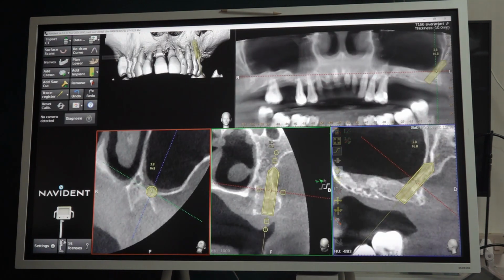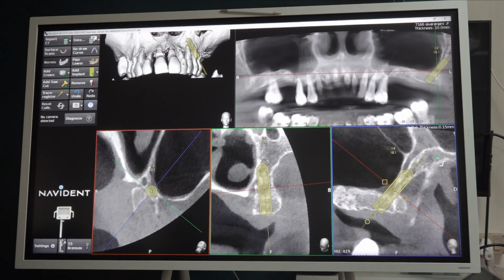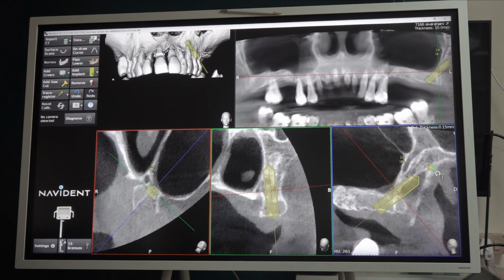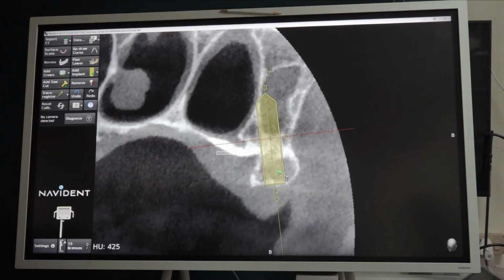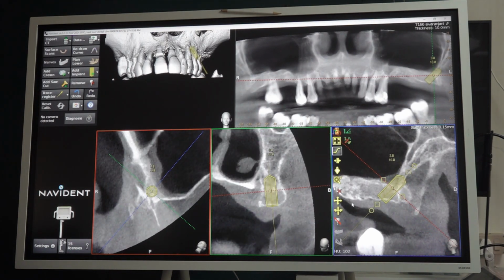Now we'll see the buccal in the first section. You can place a decent 3.75, 16 or 18 implant, provided we go at the correct line. If you tilt more distal, like this, your length will come down to 10 mm, right? So our distal tilting should be ideal. Mostly it will be around 45 degrees in this situation.